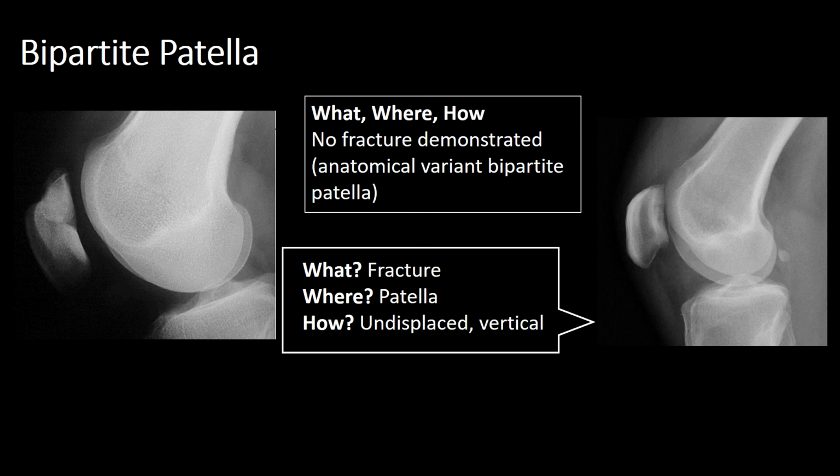Conversely, because it is a vertical fracture, it's not demonstrated on the lateral view, particularly as there's no displacement.